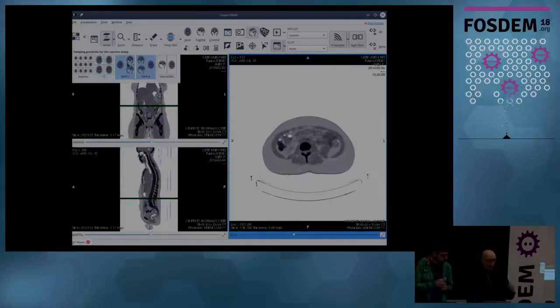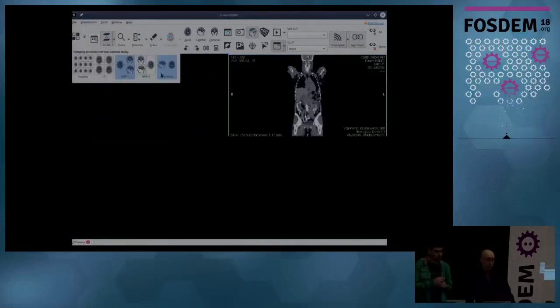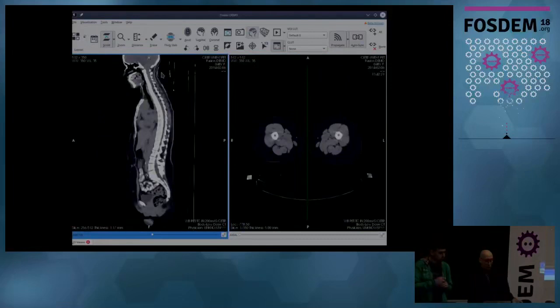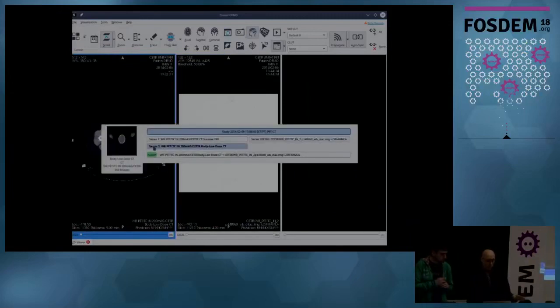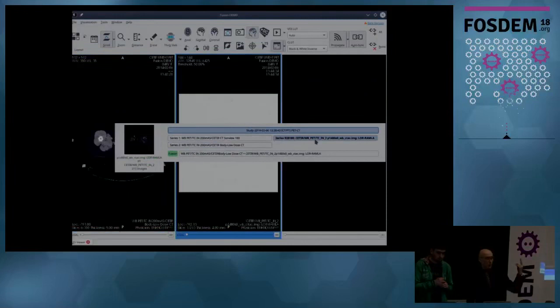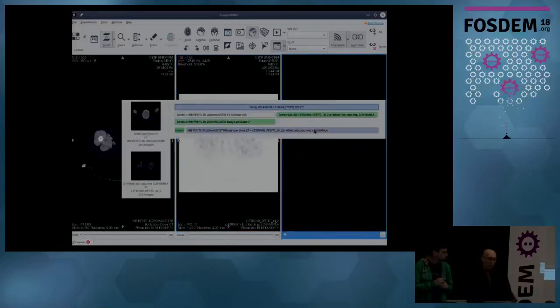Then there is what we explained before, which is the hanging protocols. Hanging protocols are templates that can be customized with XML files, so that if you are a doctor, you can set up your diagnosis environment quickly. But in this case, I will put a manual layout of 3 viewers, okay? In these 3 viewers, if I right click, I have series 2, which is the CT scan, and here I have another series, which is the PET scan. This is nuclear activity, okay?